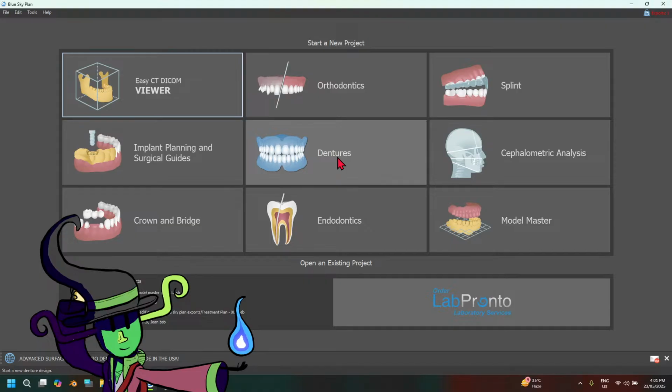I think those are one of the more, not really complicated, since everything here is technically complicated to a newbie, but we're gonna explore this in our next stream, and hopefully we'll learn something new in Blue Sky Bio. I also think of maybe learning a little bit about MediLink. It's another dental software that I've heard people use before. It's also free to download. Not sure how their exporting features work, but we'll test it out in another stream.